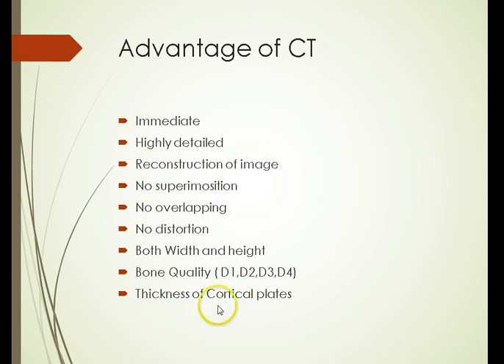And it also gives us the thickness of the cortical plate, which is also very important if you're doing some of those teeth in a day or teeth express or all-on-four techniques. And you're looking for that cortical bone and primary stability.